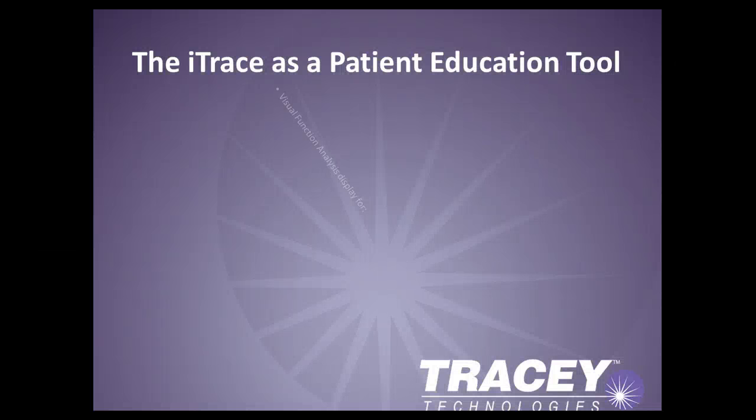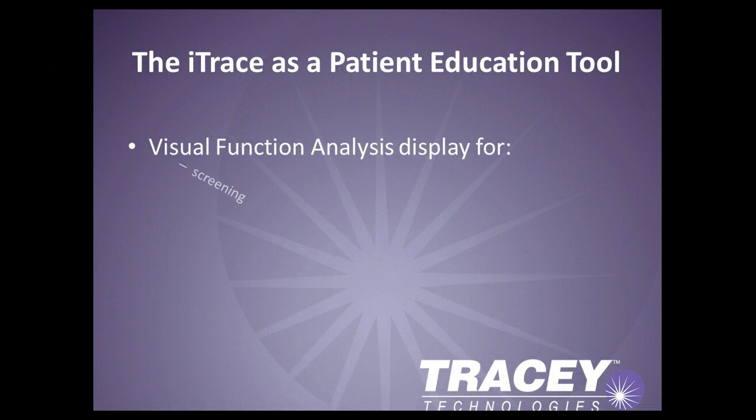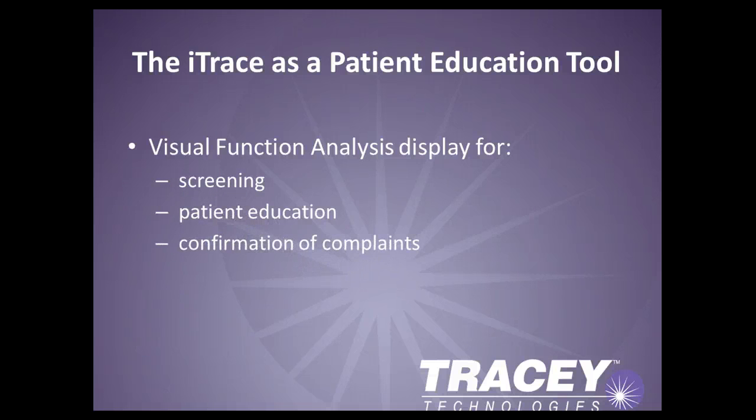The Visual Function Analysis display provides a great screening tool for analyzing the patient's vision and determining if additional iTrace analysis or other diagnostic tests may be necessary. We review another powerful screening display available with the iTrace, the Wavefront Corneal Topography Summary Display, in another webcast edition.